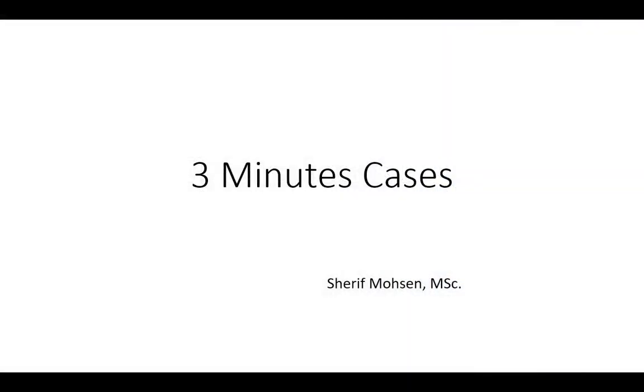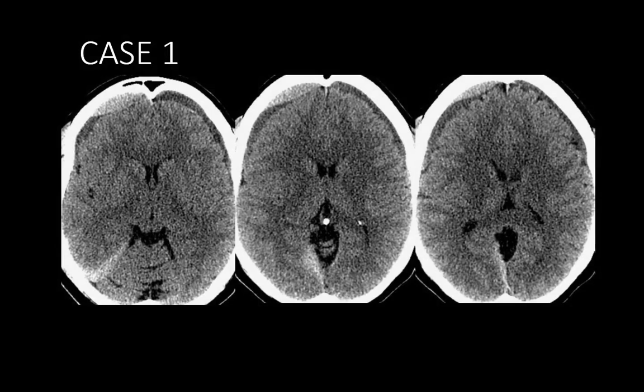Today we have some cases of head and neck emergencies. This is the first case. These are some selected images of non-contrast CT axial slices of the brain. Please take a moment to examine it.